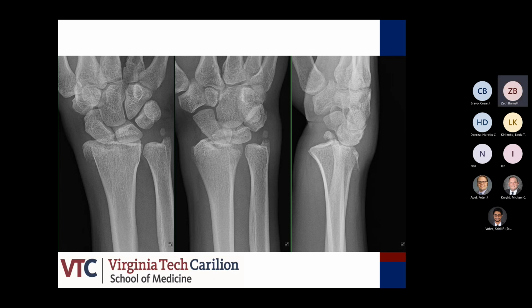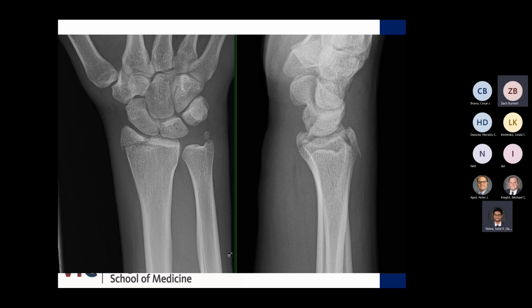It's a very distal fracture. I think, again, get it reduced, and see if there's a fragment dorsally that can be tamped up and help to hold your reduction. So this is that post-reduction styloid piece as well.